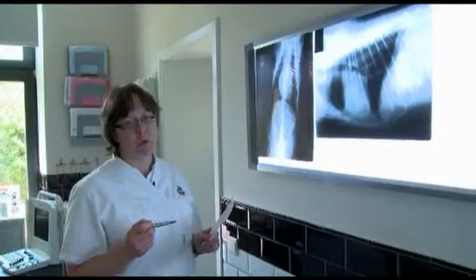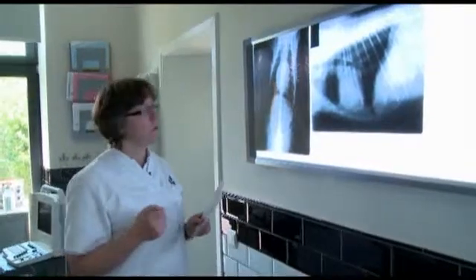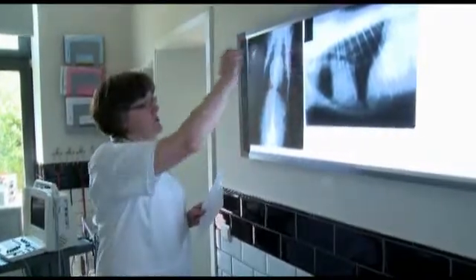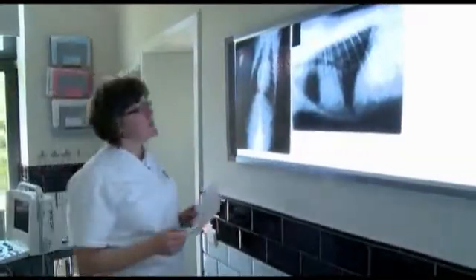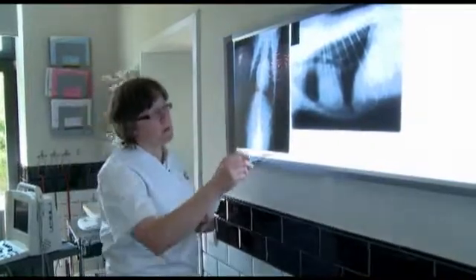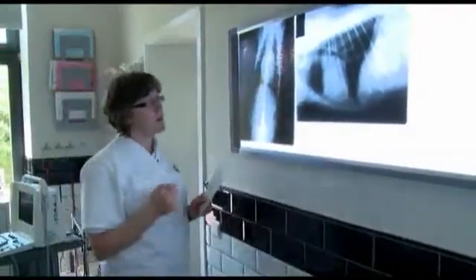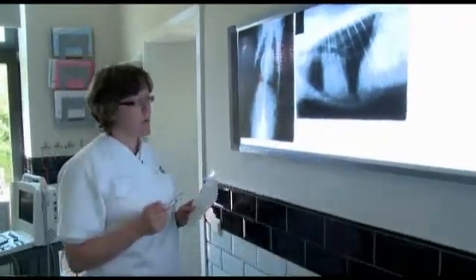Like for any radiograph, after having looked at the quality of the radiograph, if it's interpretable or not, we are first of all going to have a quick look at the extrathoracic structures. Secondly, we can have a look first at the cardiac shadow or at the respiratory system, depending on what your priority is, but as long as you always use a systematic approach, you will not forget and overlook something.